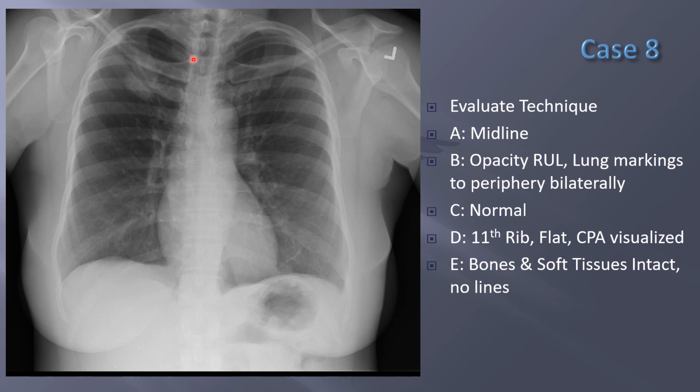Breathing, field of lungs for breathing. I look at that lung field. I see lung markings, these little lung markings all out in the periphery on both sides. Then I look bilaterally. I see like this little hyperdense area. I don't see it over here. I see it there.